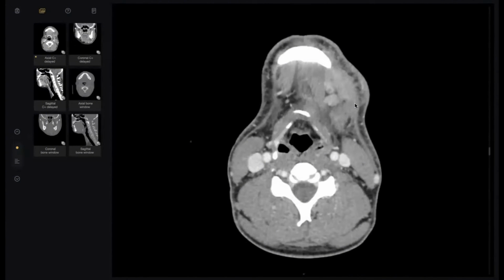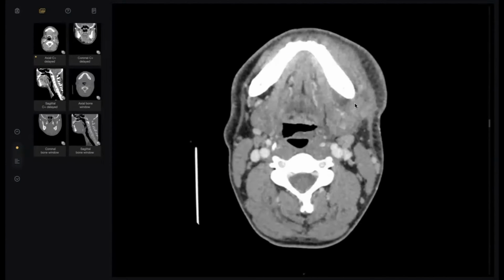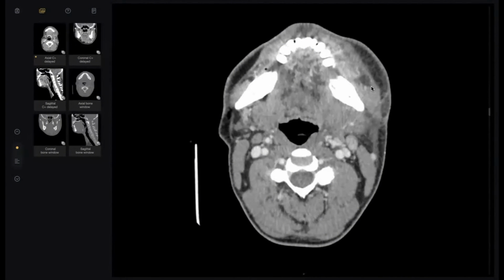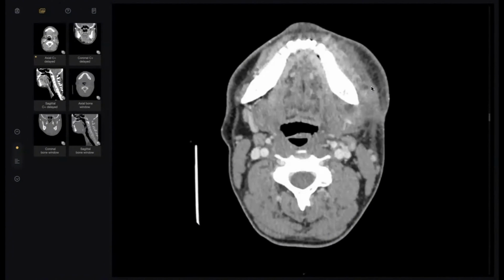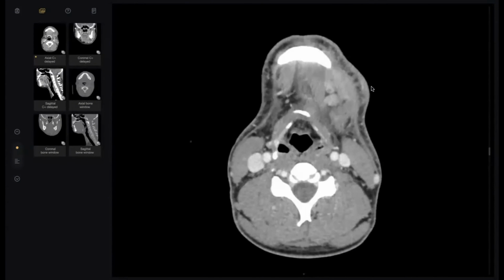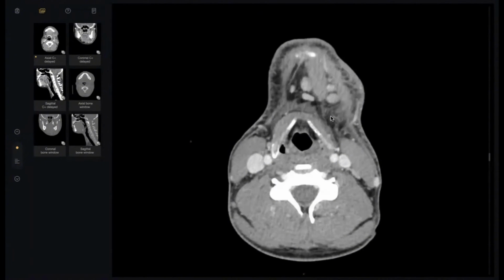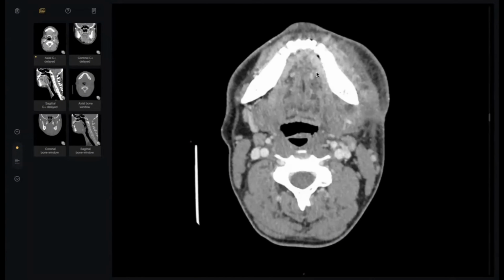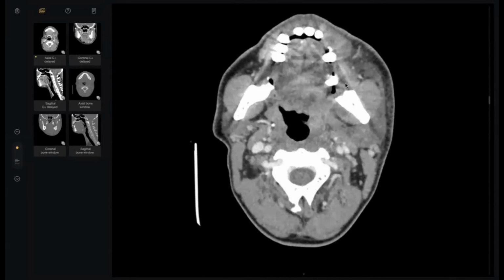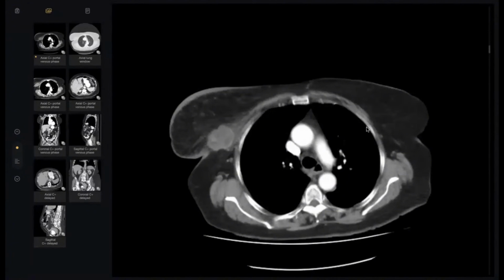Thank you, doctor, so much. My colleague, my advice to you, trust in yourself. What is in your mind is the best answer. Okay? This is a hypodense area surrounded by thickening. See the thickening here, affecting the masseter, affecting all the tissue here. And the question here is, this is an abscess with peripheral enhancement. What is the name of this area? Trace first the submandibular gland. Oh, this is the submandibular gland. Okay, this is the tongue, and this is the mandible. If you told the examiner this is a submandibular region, he will be happy also. No problem. Thank you so much, doctor.